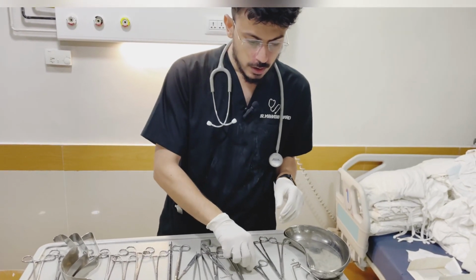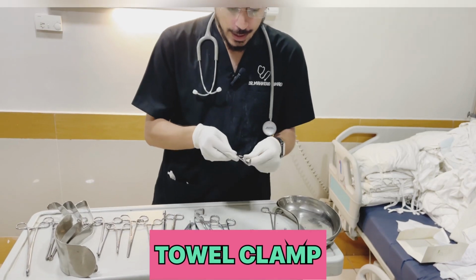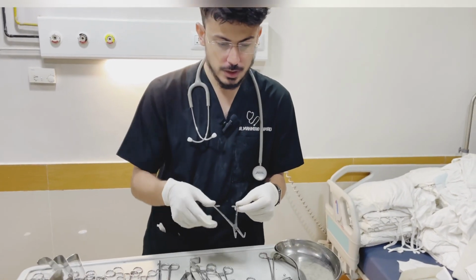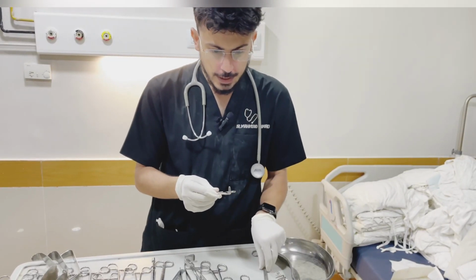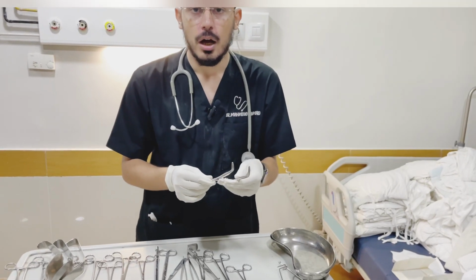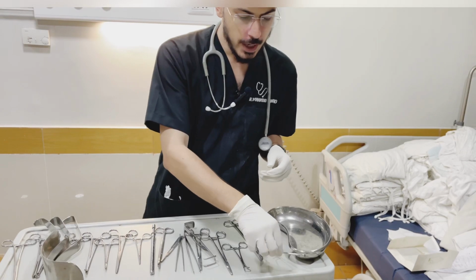And this is the towel clamp, and this is known as the right angle artery forceps. You can see that it has a bit of a 90 degree angle at the terminal portion. So this is the right angle artery forceps. This is also a right angle artery forceps. It is usually used to control bleeding from blood vessels by clamping the artery.